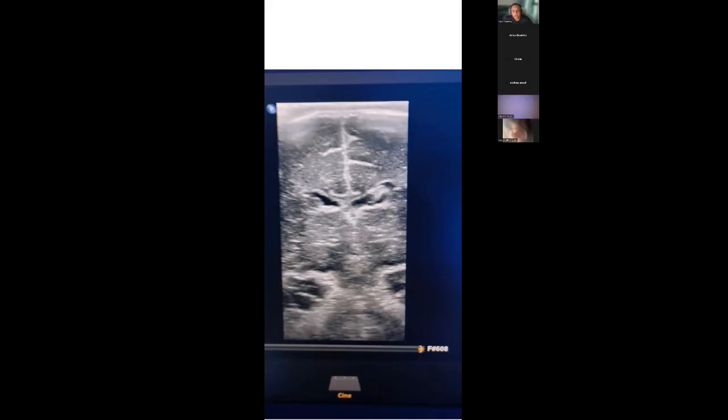In particular, if you're looking at the extradural space or the subarachnoid space, you really want to differentiate them. If you're worried about hemorrhage or possible CSF remnants, then yes, you can use the linear probe in that situation. But another really good example of use of the linear probe, Nashwa, very good.